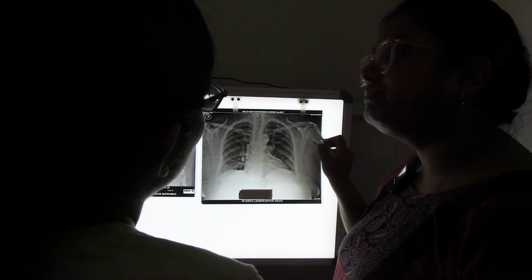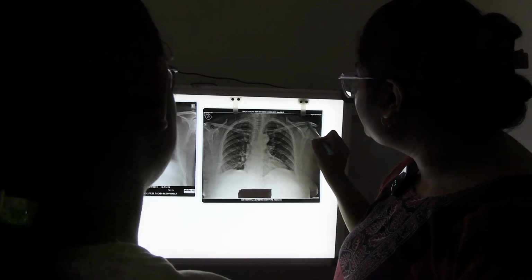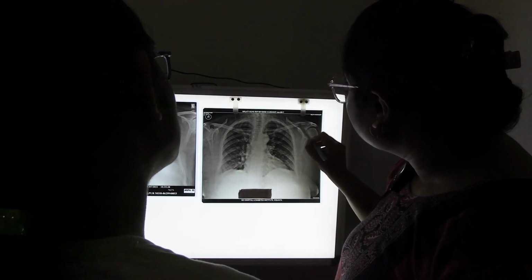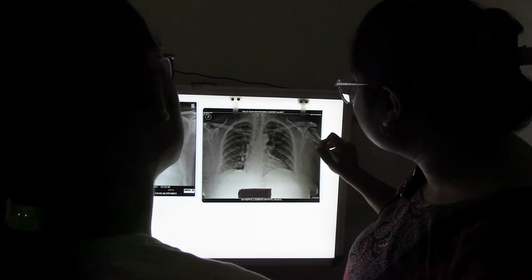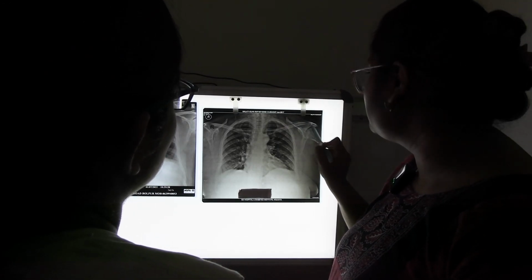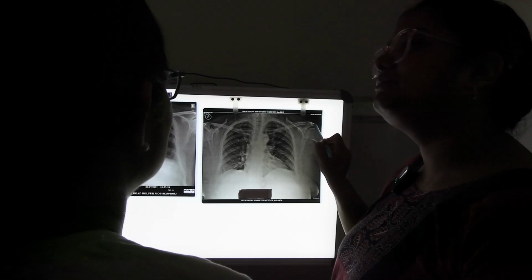Here is the acromion process. It is a continuation of the spine. This is the superior border mainly, and this shelf-like projection is the spine. And this is the crest of the spine. And here is the acromion process.